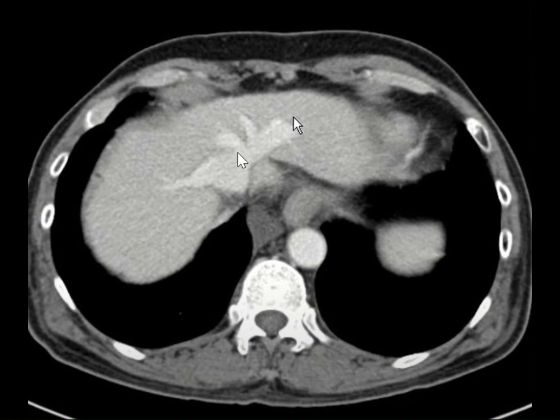Again, the right and the middle and the left hepatic veins are seen here, draining into the IVC. So this is the upper hepatic segments, okay? Whenever you see the IVC inside the hepatic parenchyma, we are in the upper hepatic segments. So this is 2, and this 4A, 8, and 7.